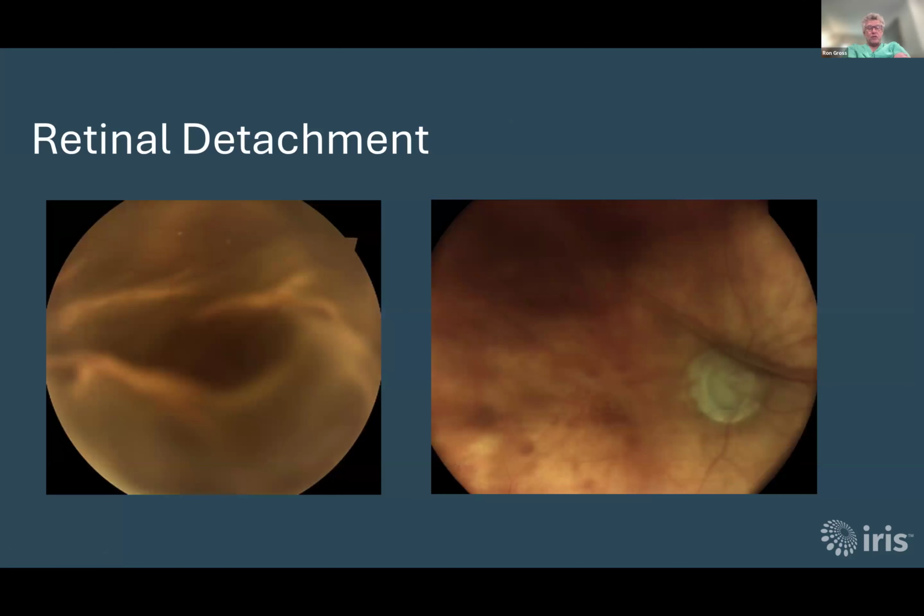And I think this is a retinal detachment. We talked a little bit earlier about how the retina can totally come off the back of the eye. Here you see no structures because it's just all wadded up. You can see kind of the traction and the scarring that's occurred, or those big white bands. Things are of different focus.